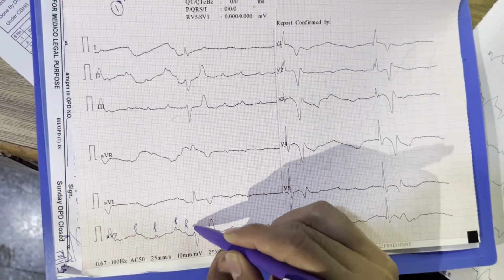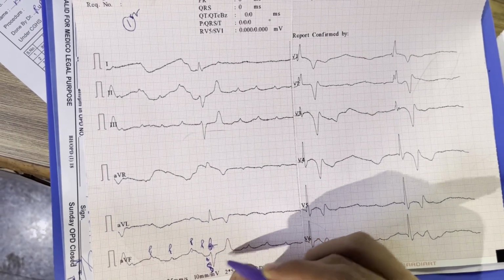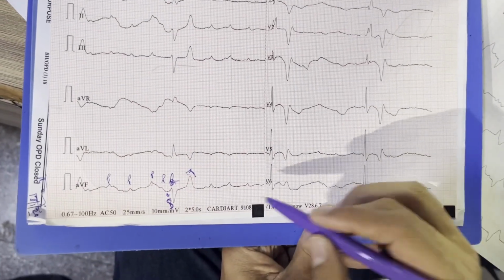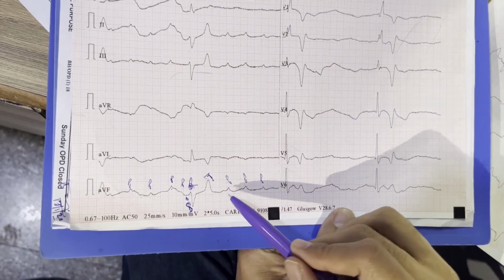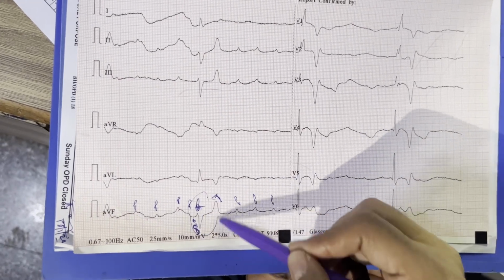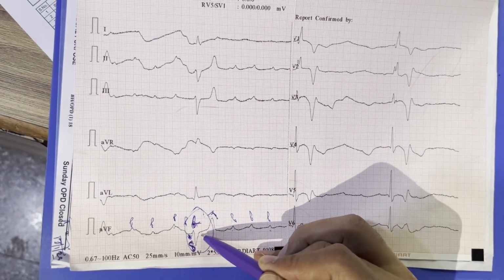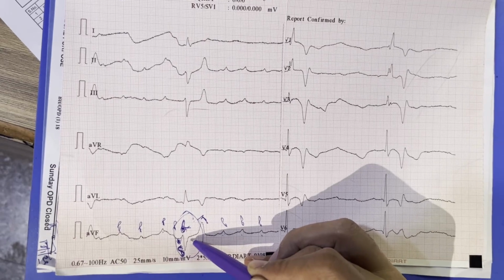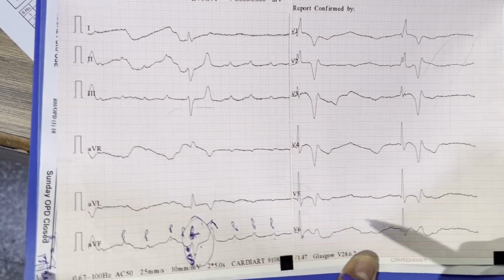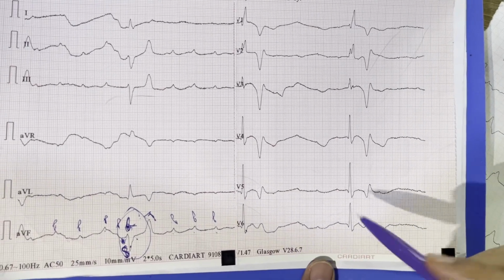Here also we saw a QRS, Q, R and S, and this is a T wave. So here also we can see a lot of P waves which are not followed by QRS. So these atrial contractions are not reaching ventricle, and this ventricular contraction, that is Q, R and S, is wide, means it is originating from the ventricles. So wider QRS escape and very low heart rate indicates ventricular escape rhythm, not the escape from the His Purkinje system.